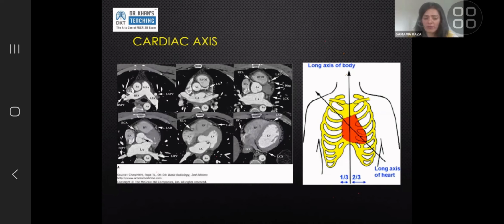If you are an experienced cardiac radiologist, or if you learn that technique, you will look at the valves and try to figure out, okay, I'm going to look at the aortic valve, I'm going to look at the mitral valve. If the aortic valve is open and the mitral valve is closed, I know that the patient is right now pumping blood out of the LV, so that must be a systolic phase. Now, if it's a systolic phase and the heart is contracting, it's doing its best to be as contractile as possible. At that point, you can't measure the LV wall thickness. So that value, even if it's, for example, 9 millimeters or 7 millimeters, you can't really call it thickened.